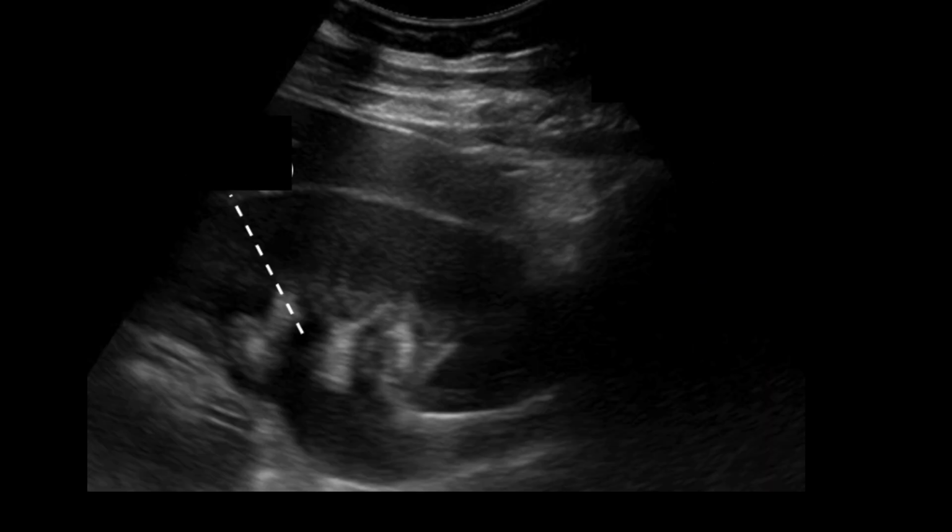Okay, so this is the kidney. And, I put this, so this does catch you out every now and then. I remember there was this really septic patient that was treated for GI. So she was treated for septic shock, from GI origin. And I can't remember if I ultrasounded her, but she went to Cape Town and they CT'd her and she had hydronephrosis. So she ended up with a stone with hydronephrosis, secondary infection, and that's why she was septic.